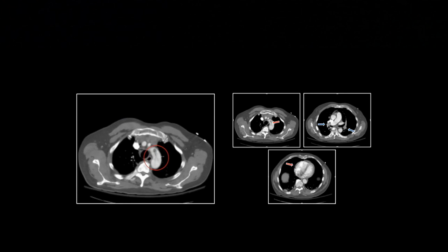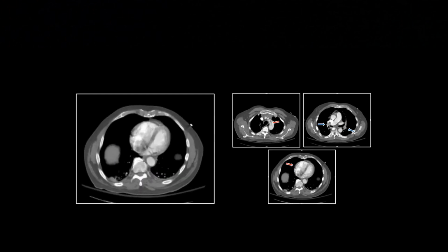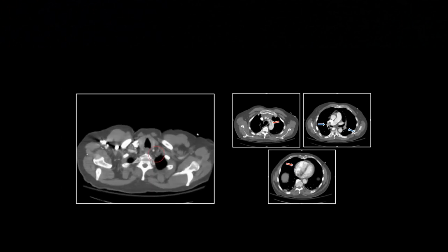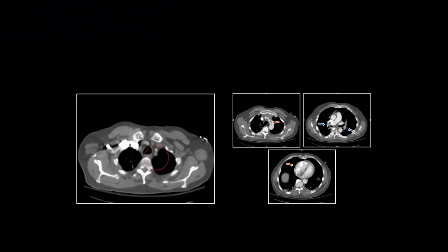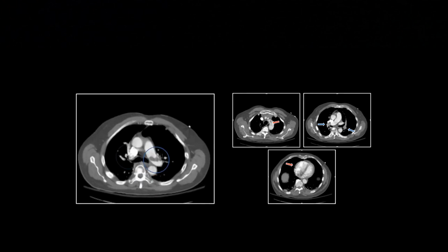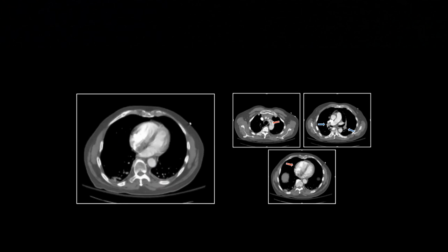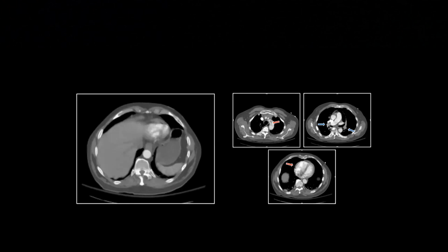Oh, there we go. So it's running awfully slow. So you can see that clot actually was extending up into the left subclavian. Big clot burden, the main pulmonary arteries, and then right heart enlargement suggesting the chronic presence of an ASD. All right, so that is a case of paradoxical embolism. When you see pulmonary emboli, but also aortic clot, the presence of an ASD can be assumed, especially in the presence of right heart enlargement.